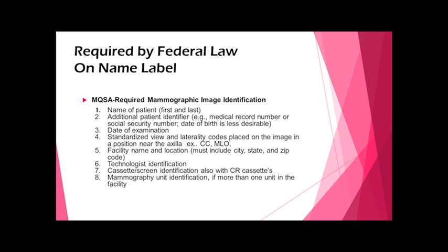The standardized view, whether it's CC or MLO, must be positioned near the axilla on the MLO and laterally on the CC. Facility name and location must include city, state, and zip code, but you don't have to have the street. Technologist identification, whether it's the technologist's initials or tech number 1, tech number 2, tech number 3. It doesn't matter as long as you're able to state and identify which technologist took the image.